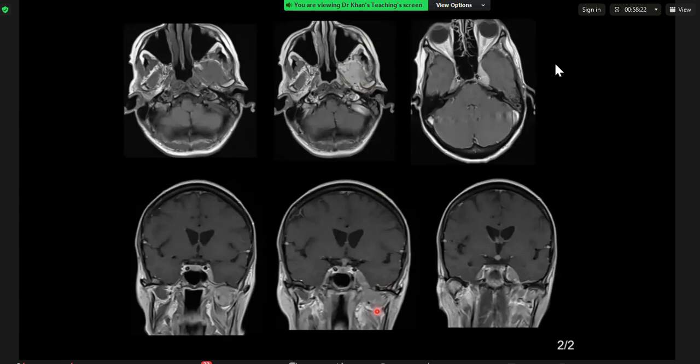Yes, involving what seems to be a masseter muscle and also close to the mandible, the mandibular condyle, and involving the pterygoid muscle. And I'm looking specifically for any sign of bony destruction here, which I can't quite see because on T1 I can see the cortical bone is preserved.